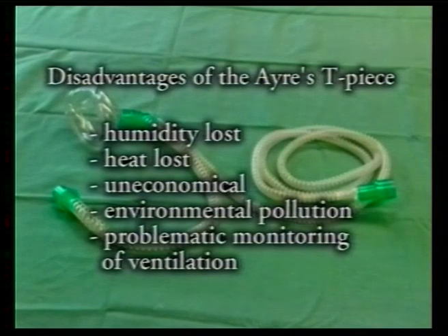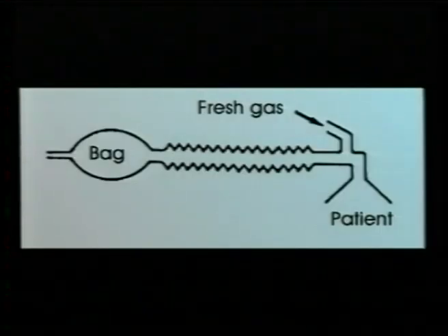With the classical systems, it is difficult to monitor ventilation and to perform artificial ventilation. That's why modifications are used which are supplemented with a reservoir in the shape of a bag, which makes it easier to monitor the spontaneous breathing and provides for easier artificial ventilation performed by hand. The most common modification is by Jackson-Rees, its special feature being an open-ended bag on the expiratory part.